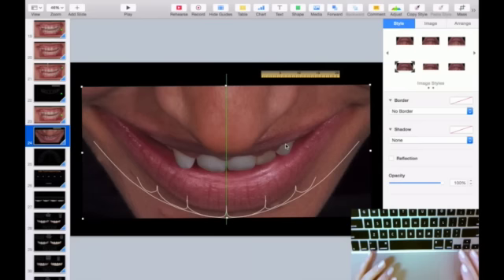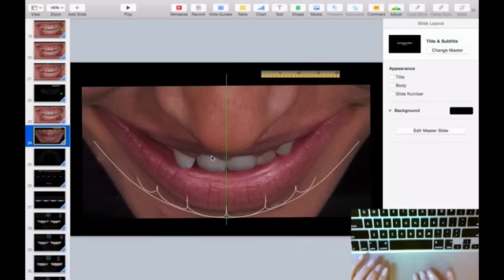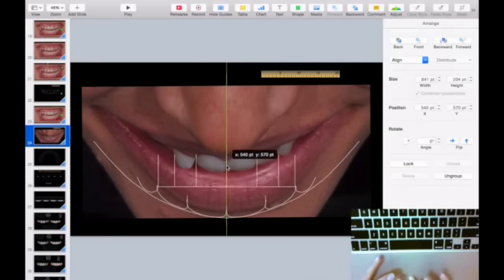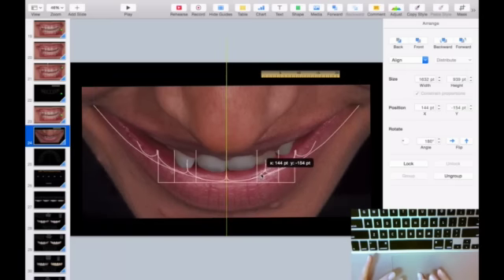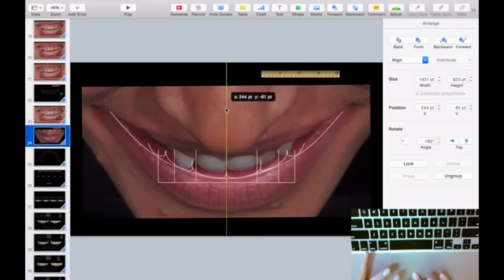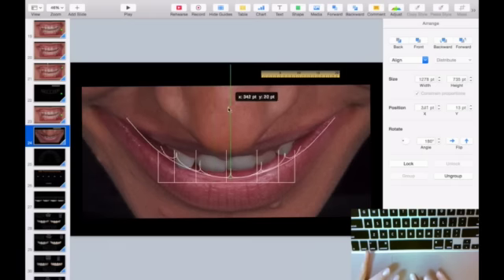and I'm gonna place this on my bow. I'm gonna get my reference, my guide, and I'm gonna paste it here. It's calibrated already with the midline, so I just place it there, and I have the positioning where teeth should be at, and now I'm going to calibrate this to that. So I make this fit here.